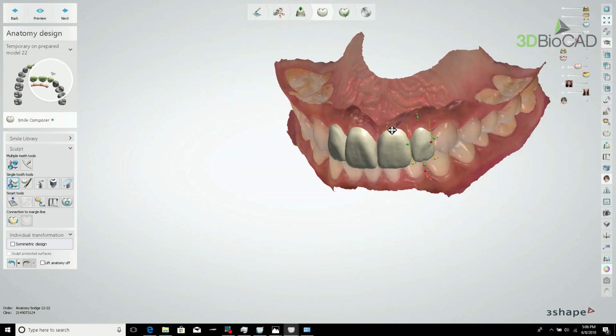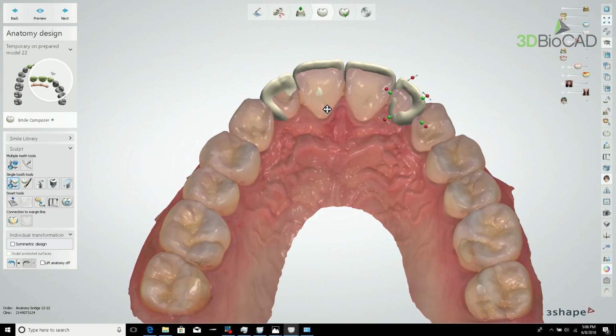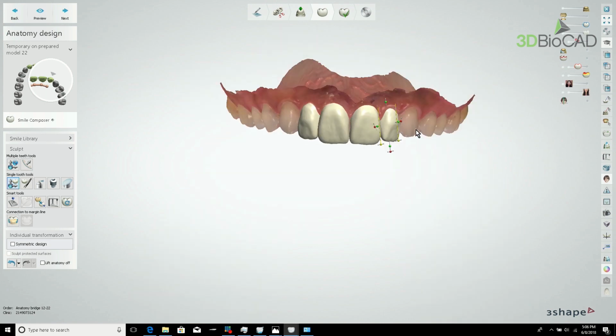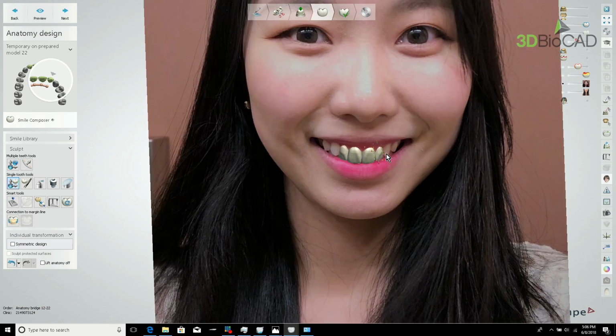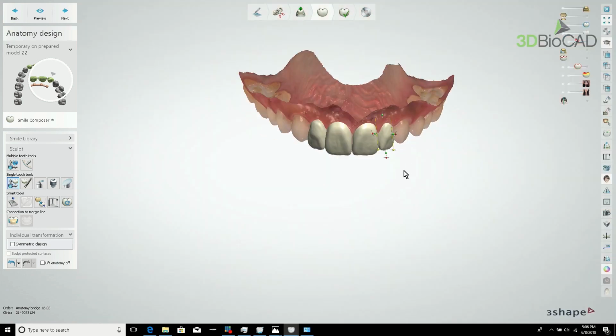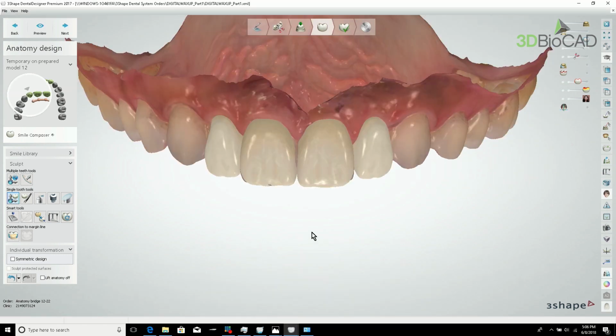So this design function, again, has no margin, no direction, no die interface, nothing there. Just put the tooth on top of it. If you want, put in the patient's photo, merge them with each other, check together, and make sure it looks good and everything's good. We're good, right? So I just did this quickly, but I have another one that I did a little better.